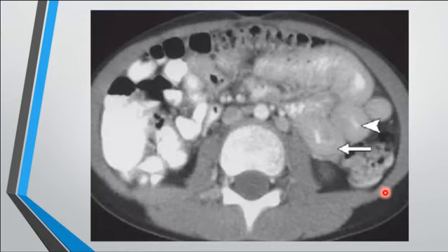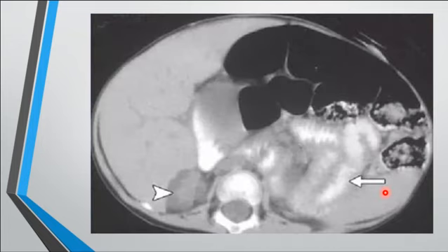Anyway, if I told you there is a lung problem with this guy, some respiratory problem, Langerhans cell histiocytosis. This was a case of Langerhans cell histiocytosis, which is quite good. Good job. Now, I'm just showing you all the causes of bowel wall thickening. There are a lot of things that can cause bowel wall thickening.